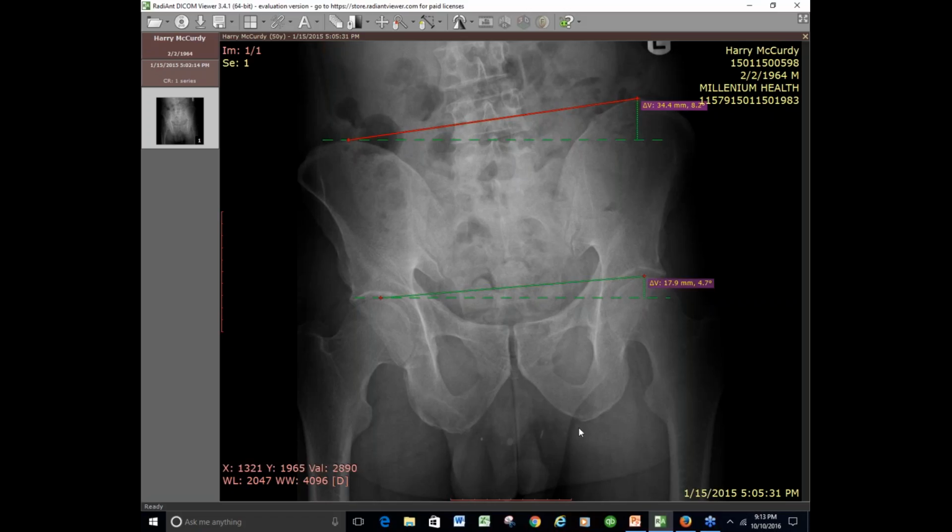Fantastic, good. So I'm going to do the same thing over here, and again, without blowing it up, I'm just guessing, but we're ballparking this for right now. This one's saying 11.2, so it's saying 23 millimeters of difference, and that's probably just because I'm not on the right spots. It's probably closer to here. So let's just say that's 10.8 and 34.4, and 34 minus 10 is 24, so we're about that same number that we got, right? Everybody agree? I know I'm going through this quickly.